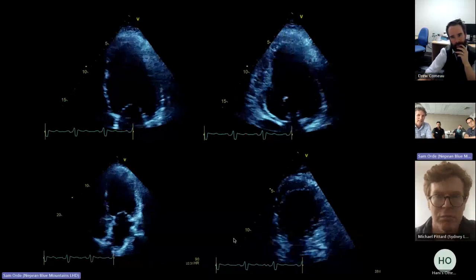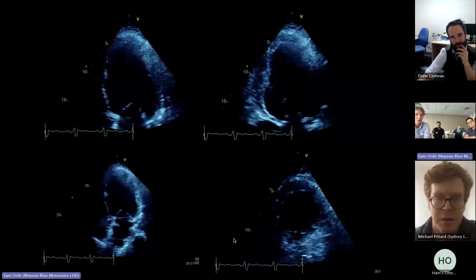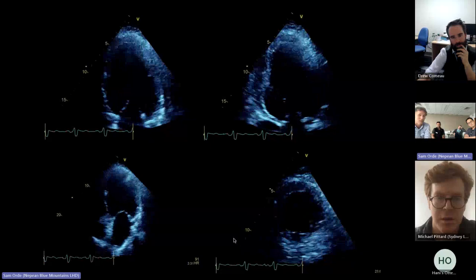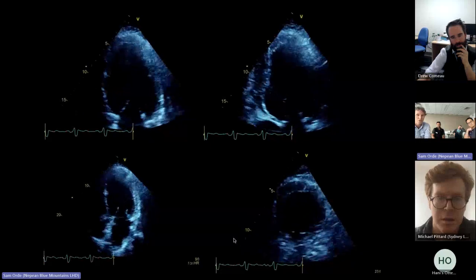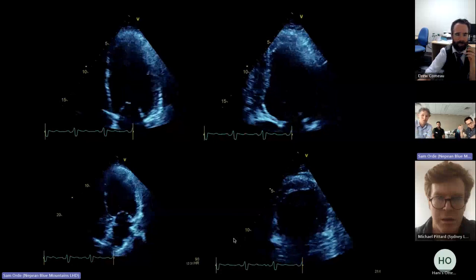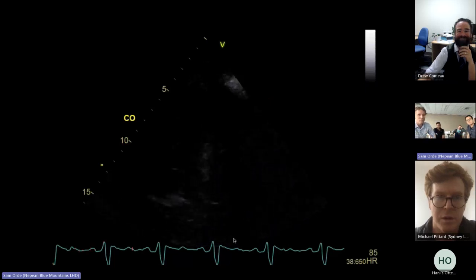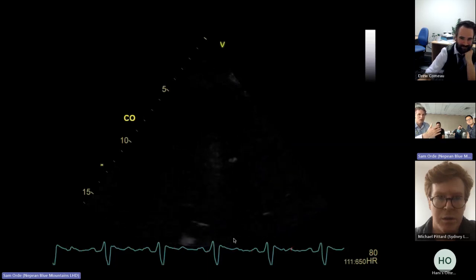And I think that's exactly how I would put something in my conclusion, saying that although it's impossible to say definitively, there is a suggestion that there may be a thrombus, but you need to do a contrast study. And what's so interesting is, as we do this contrast study, and I'll just run it through in a second, is how much more confidence you can provide to that answer. So Drew, I'm going to see how confident you are in a second. First of all, as I let this run, I just want to show you the contrast.